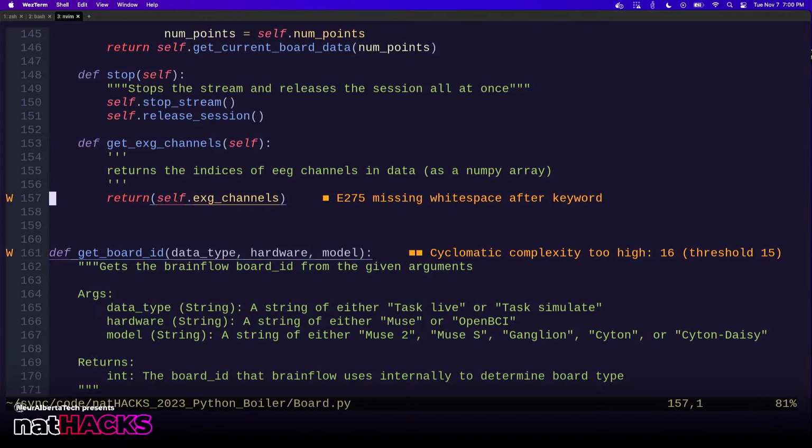One thing to note about BrainFlow is it stores data in an interesting format. So what BrainFlow does is it works with arrays of data, because with headsets, typically you have multiple channels as well as other types of sensors. So how BrainFlow handles that is it gives you an array of data and an array of mappings saying which bits of data are what.